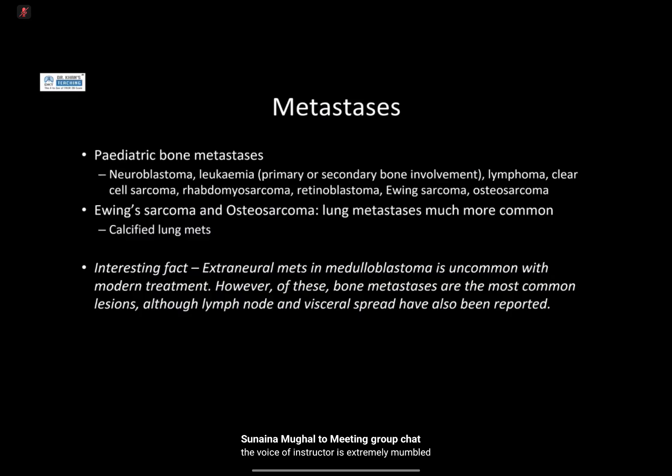So I think that this is a really nice case. Actually, Sam knows this case better than I do. I think the patient had a neuroblastoma, and the example is a metastatic deposit in the distal femur. So thinking about metastases, I know in children it's not something that we jump to first, but having it in the differential is really important.